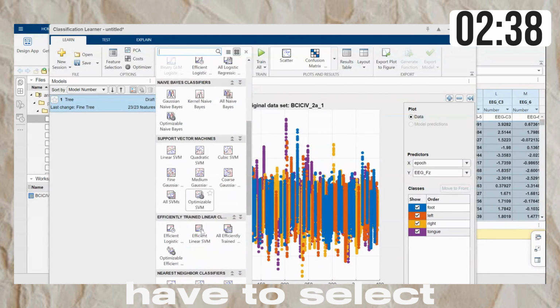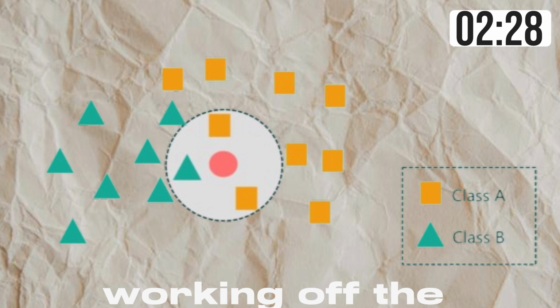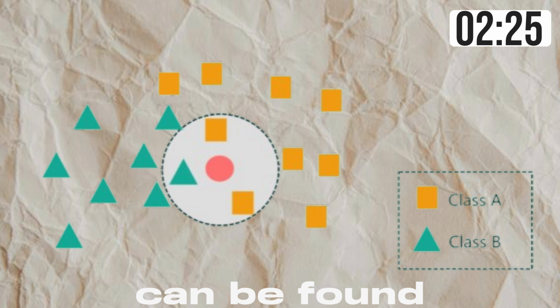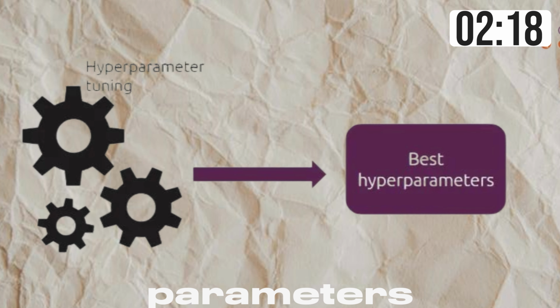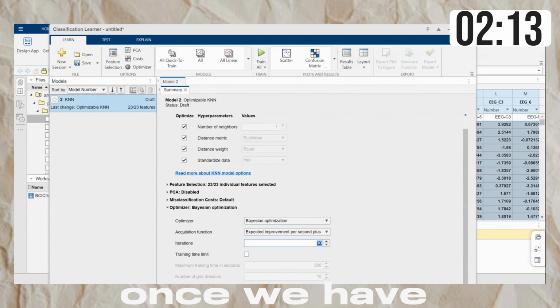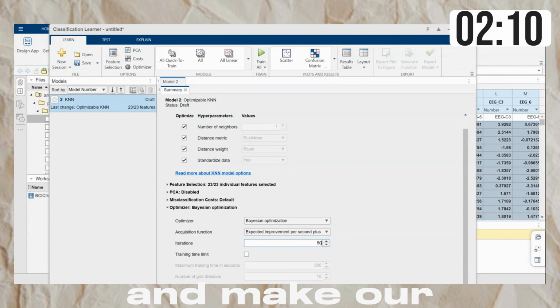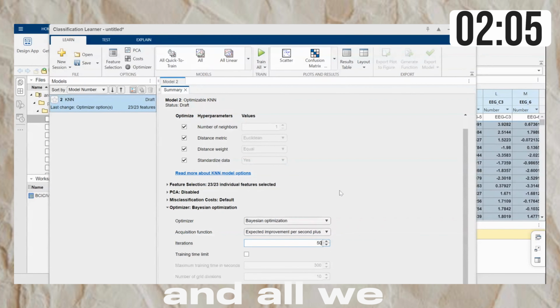Next, you have to select a model that you would like to use. I chose the optimized KNN model as it's commonly used for classification, since it uses proximity to make classifications, working off the assumption that similar points can be found near one another. We use this optimized version because it adjusts the hyperparameters towards a higher percentage for accuracy while testing. Once we have that selected, let's go ahead and make our iterations about 50, since we don't want our training to finish prematurely, do we? And all we've got to do now is hit that train button.